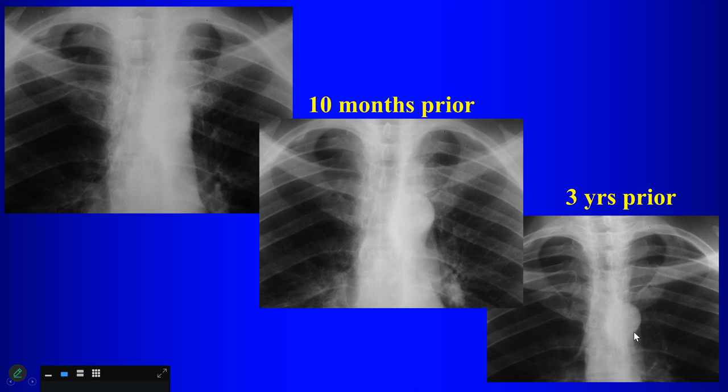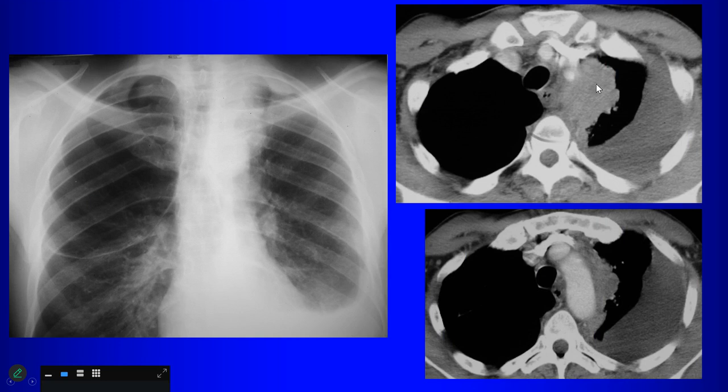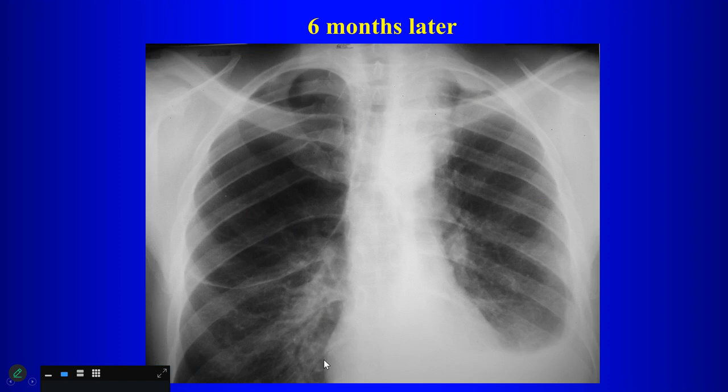Look at the aorta here. AP window's down here, right? There's something here, left paratracheal region next to the aortic knob. Okay? Big mass up there, next to the knob, going up.